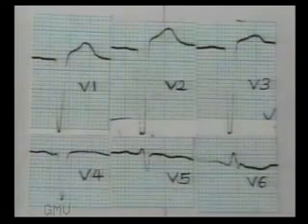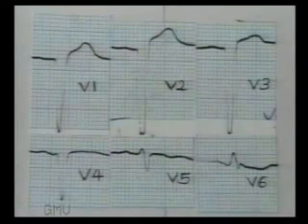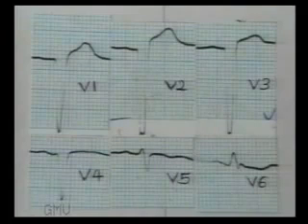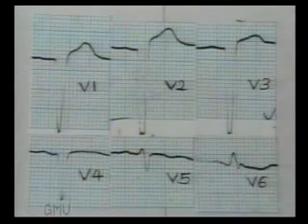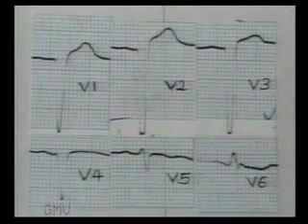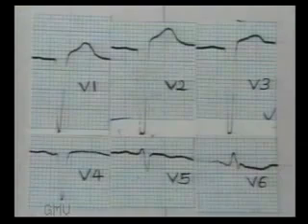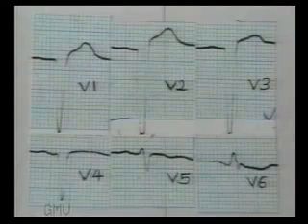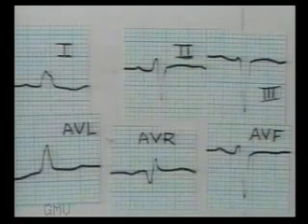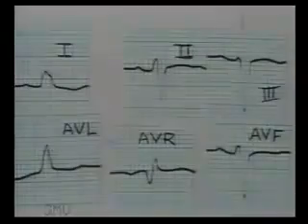In the chest leads, wide QRS complexes with increased amplitude are immediately apparent. Study V1 and V6 for RR' pattern. V1 shows deep and wide QS complex. V6 shows broad R wave with no Q wave, a typical picture of left bundle branch block. T waves are opposite in direction to the QRS complexes, indicating aberrant ventricular conduction. There are no abnormal ST changes. So this ECG shows left bundle branch block with left axis deviation.